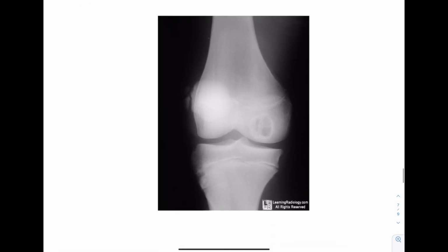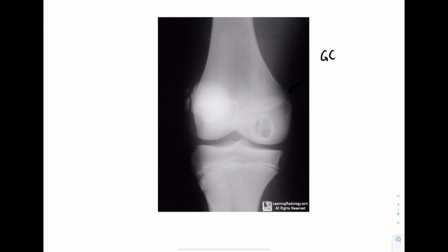All right. Now this one, we are in the epiphysis. So epiphysis, immediately I want you to think, what are the 3 things that really like the epiphyses? And it's a young person. Look, they have growth plates still. Young epiphysis. So young epiphysis is GCT, chondroblastoma, ABC.